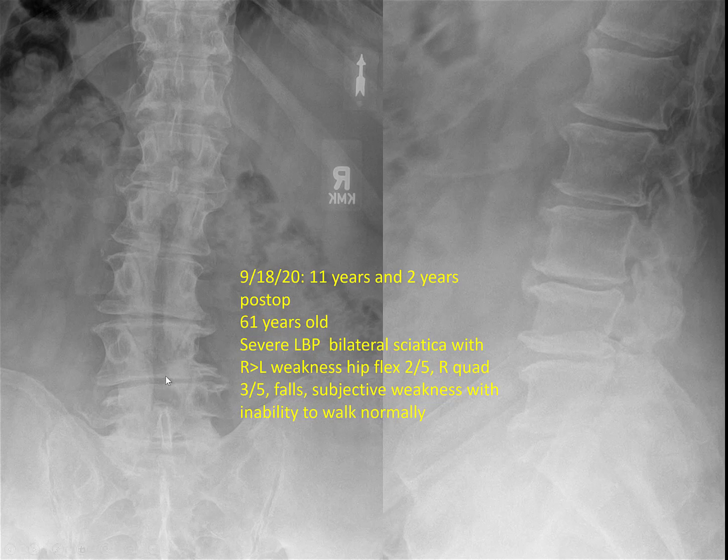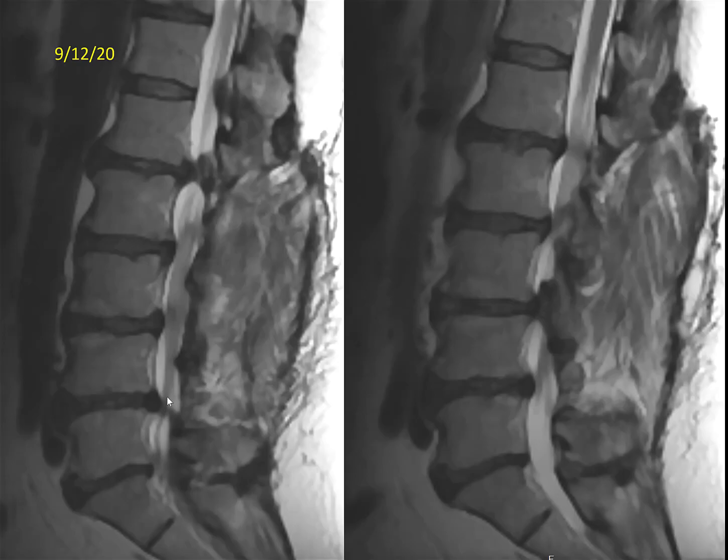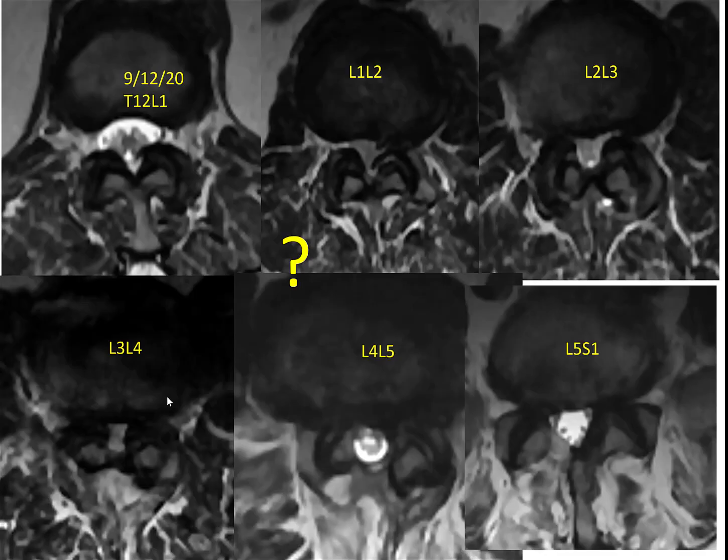Interrupt me if you want to say anything, but this guy I think is a special case where he has extremely hypertrophic osteoarthritis. You can see on the lateral, he's got osteophytes that connect. So he's got very progressive disease. And the sagittal cuts are not so helpful.